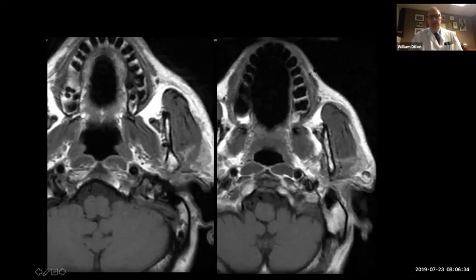But when we look at our CT, or in this case, a T1 weighted MR, we see around the normal parotid tissue, which is atrophic, a mass coming in through the parotid gland right here. And this is tumor spreading retrograde along the facial nerve up towards the stylomastoid foramen, which is located just medial to the tip of the mastoid. This is the facial nerve surrounded by fat, and it's being infiltrated by this tumor.